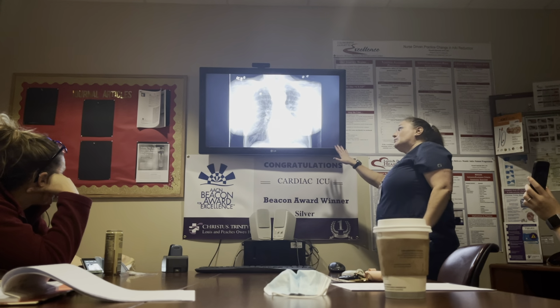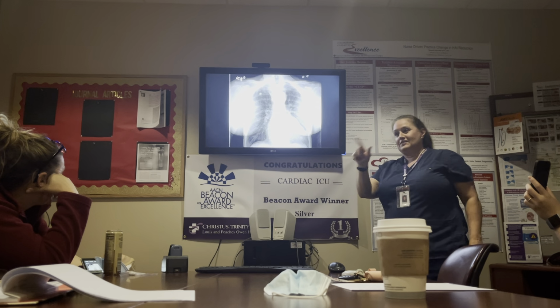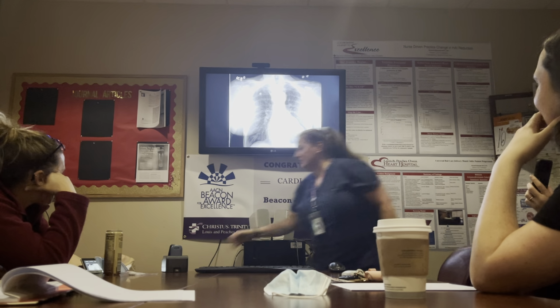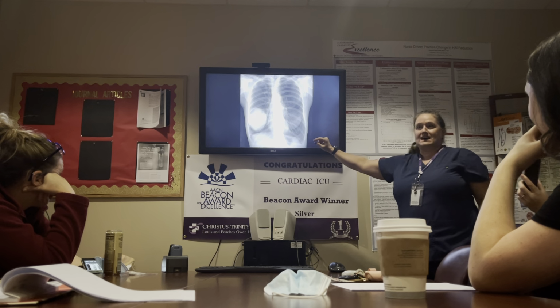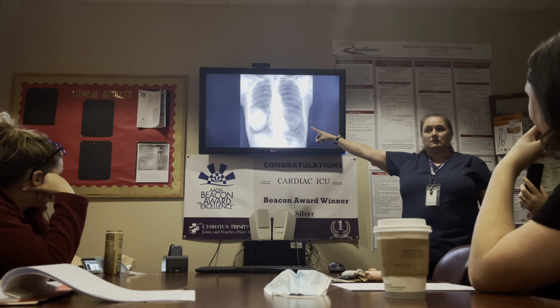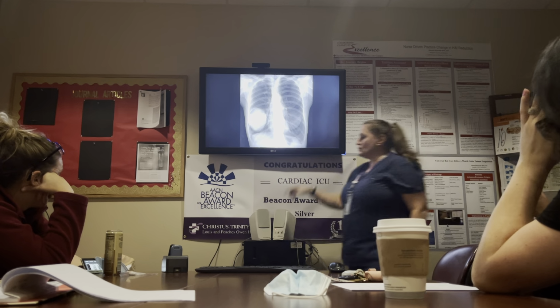A little bit of hyperexpanded lung there. Are those implants? They are. But I wanted to show you that in difference to that. That is not an implant. You kind of see brush shadows there. That is a lung tumor. So go back.